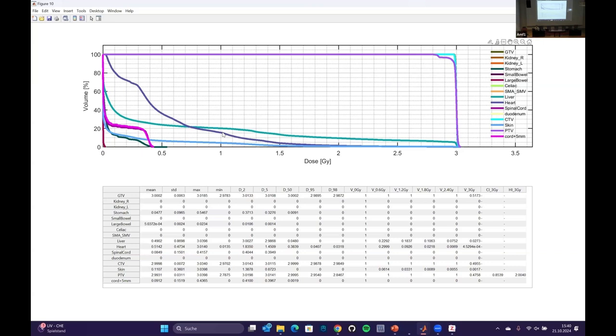So I don't want to make, that's why I kind of avoid making clinical suggestions about heart doses, because I'm not a medical doctor. And if I now say that any heart dose makes sense, I don't want this to become someone's knowledge about heart doses. But in principle, you could look for a point here and say, I just want to reduce the heart dose. Yeah, I want to make it lower.